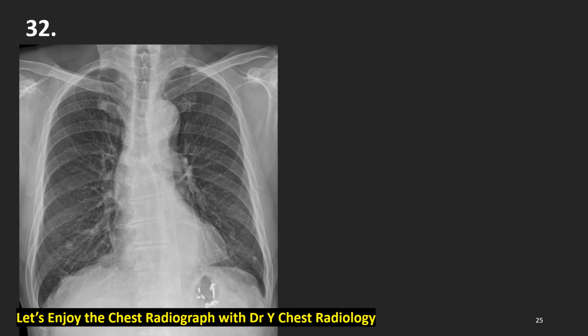What's unusual for this middle-aged woman? Just forget this one. This is endoscopic surgery for the early gastric cancer. What is unusual? Okay, you got it? Or you got them?